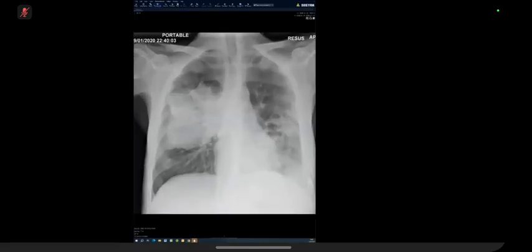Okay, have a go at this one. The patient is extremely unwell, as you can tell by the resus setting. Yes, I am presented with a plain X-ray of an unwell patient, skeletally mature. From the first look, I can see two opacities in both lung fields. The large one is on the right lung field in the mid-zone level.